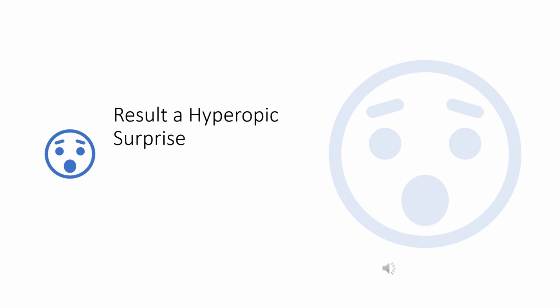So the challenge is, if we are not able to measure the flattest portion, the central 1 millimeter of the cornea, then we run the risk of a hyperopic surprise. Especially, for example, if we are measuring it through the keratometers, it measures a ring and it may give you a value which is steeper than the central 1 millimeter of the cornea.